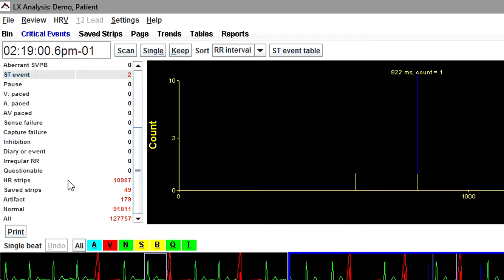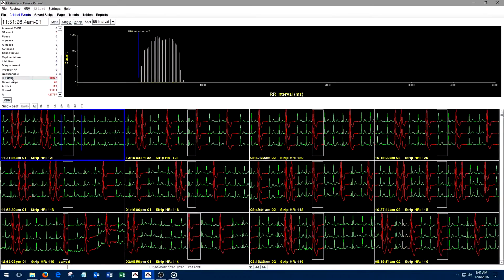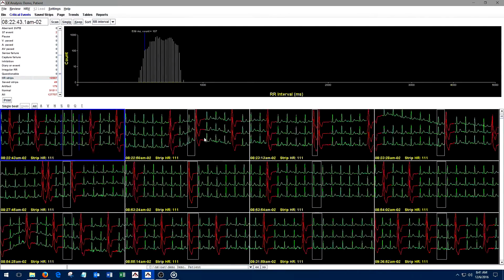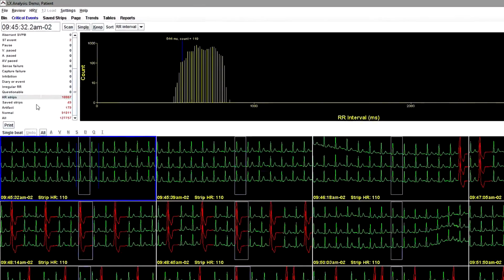Heart rate, HR strips, Enhanced Plus and Pro levels. Critical events includes this display of all the ECG recorded during the Holter period in 7.5 second strips. While some beats may appear more than once in other categories because they are adjacent to the current beat being displayed, this category displays each beat in one strip only. The heart rate listed is based on all beats present in the displayed strip.